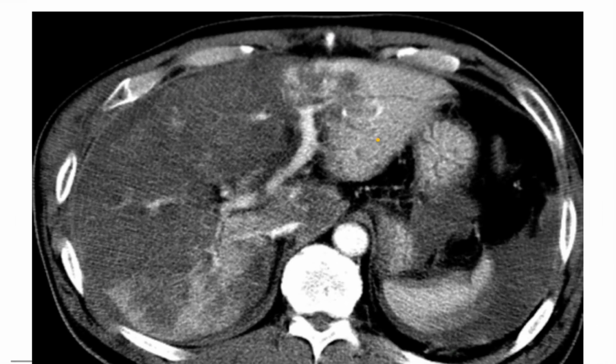Now again, see that this is a liver. You can see here laceration, okay, in the left lobe. You can see that this liver is shattered, like it is involving more than 75% of the liver. Okay, there is an intraparenchymal hematoma, and there is vascular involvement also.